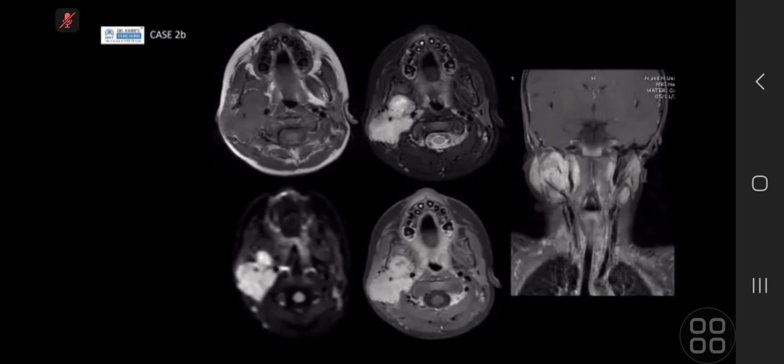This could be, but however, this is bilateral, seen in both sides. Could be this pharyngeal, in this young age I will worry about tonsillar hypertrophy. If this were adult age, I would be suspecting nasopharyngeal carcinoma, and this could be metastatic lymphadenopathy from here.